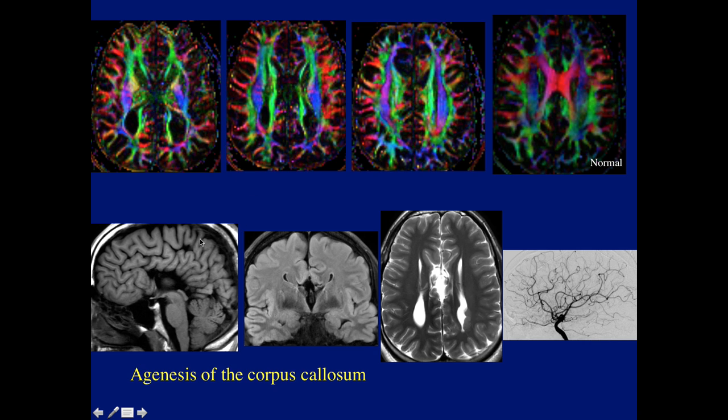And here's the rest of the study, the classic appearance on a sagittal MR, the typical shape of the frontal horn and the ventricle and the axial view. Even an angio was performed, and it doesn't show the normal curvature of the pericallosal artery. The artery comes straight up because the genu is not in the way. And what are the arrows pointing to?